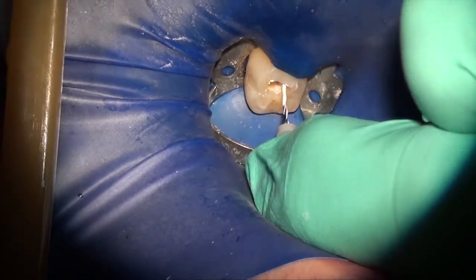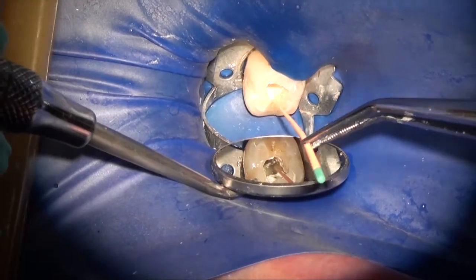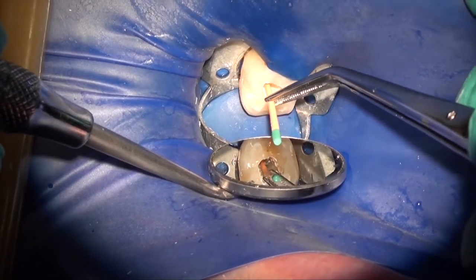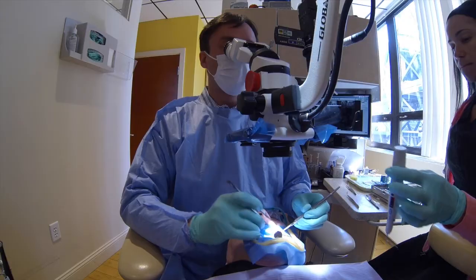If you don't have a microscope, then don't inject directly into the tooth. Simply use this finishing file to place sealer on the canal walls by injecting outside the canal on a slab.